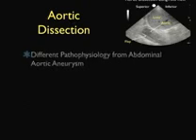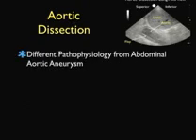Let's switch gears here and discuss aortic dissection, which may occasionally be seen on bedside sonography of the aorta.